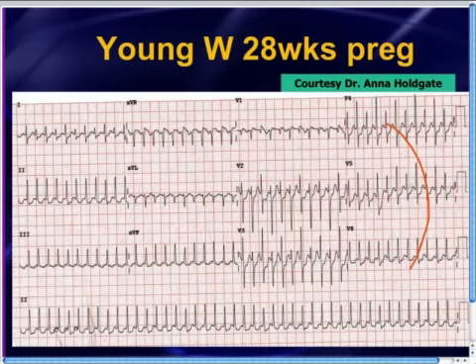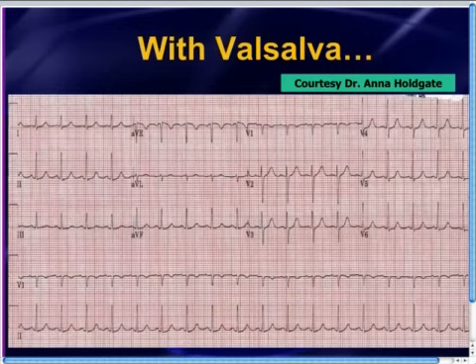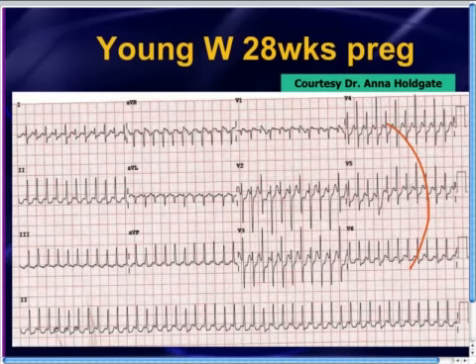They do not need to get a stress test or cath just for that ST depression. ST depression is very common and expected and has no clinical significance in patients with SVT unless after conversion it persists. And you can see that the ST depression went away once they converted. So the ST depression really doesn't mean anything.